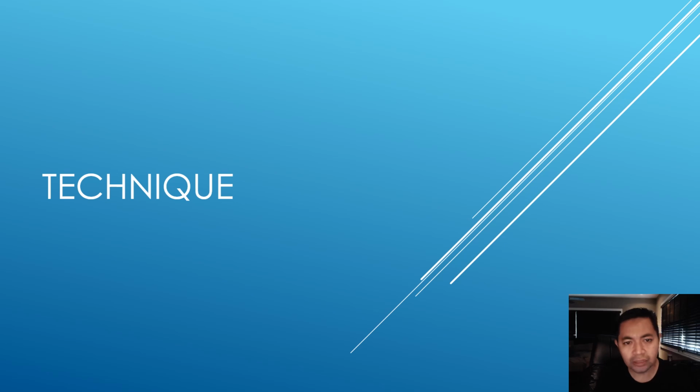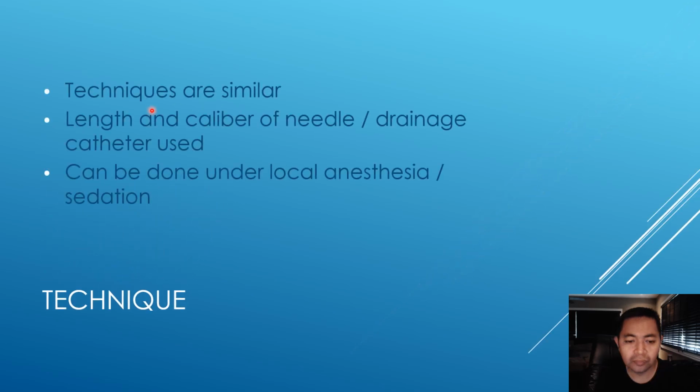So how do we start learning how to do these procedures? The techniques we employ for these procedures are similar in that all we need to do is to successfully guide the needle into the structure in question with the aid of ultrasound. And from there, we employ the Seldinger technique to place the catheter into what we want to drain. Only the needles and the catheters differ. All of them can be done under local anesthesia with or without sedation.